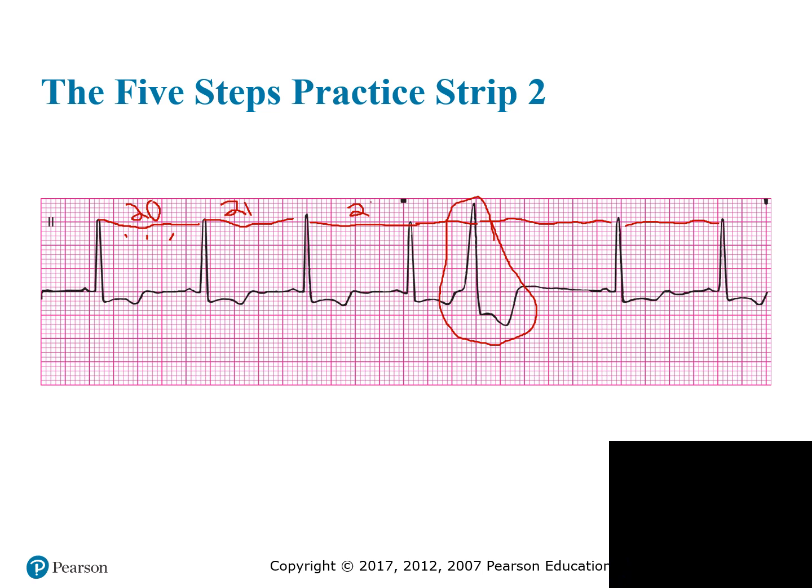So far it looks like a regular beat till we get to here probably. 5, 6, 7, 8, 9, 10, 11, and 12.